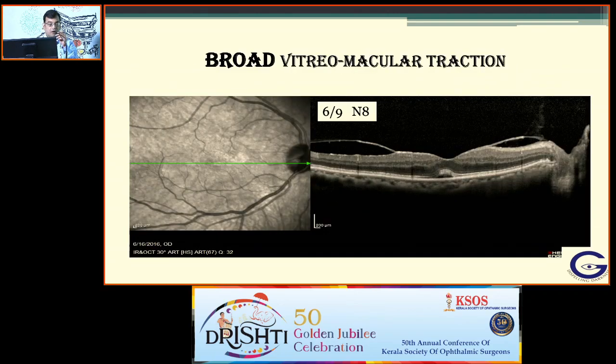It can be focal, or this is a broad based adhesion. In broad based vitreomacular traction, usually the vision doesn't worsen very badly.